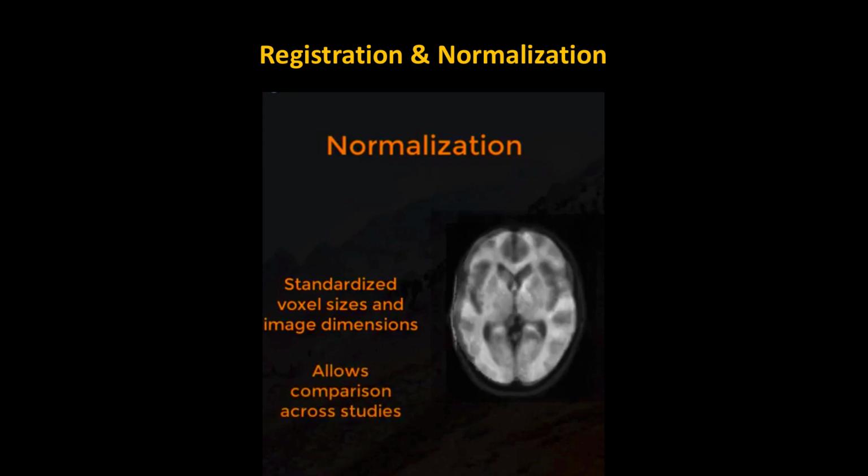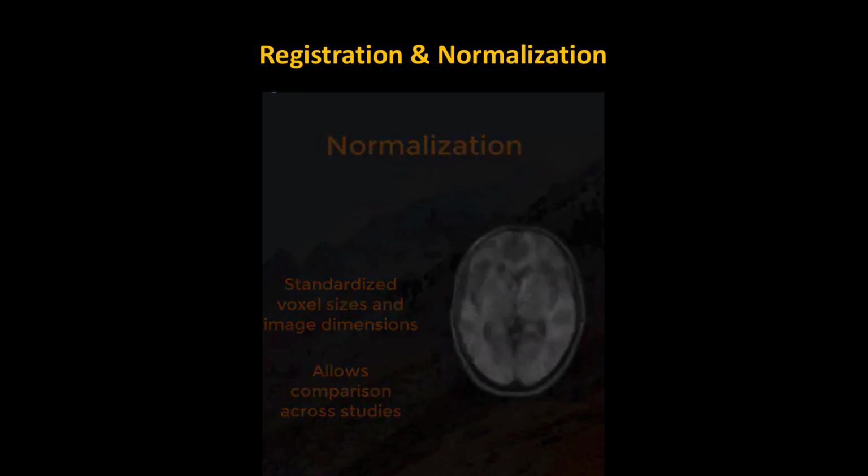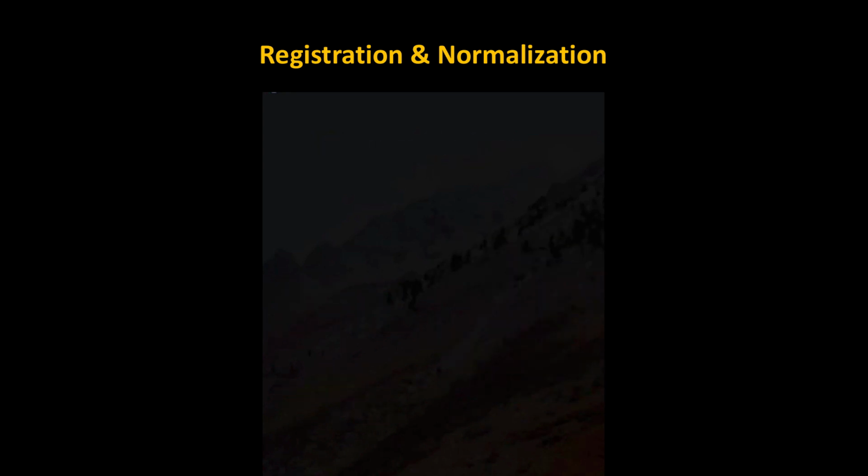And in addition, these days, MNI appears to be the most popular choice, right? Talairach is on its way out, so I would strongly discourage you from using a Talairach template. But the CONN Toolbox, I don't think even allows you to do that. The last part was showing that MNI is an average of these.